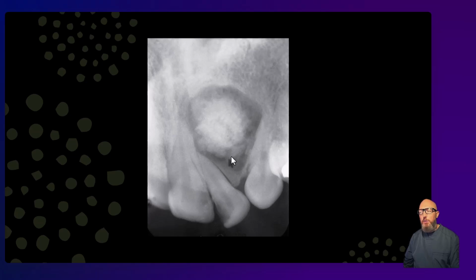Hopefully you're thinking of two things. The first one you might think, oh, is this female or male? You're maybe thinking AOT. What's the second one you should think of? Probably COC. And that's what this ended up being. Remember, COC is the bimodal tumor, or the bimodal cyst, I guess I should call it, where it can occur in teenage patients or older patients and occur in the maxilla or the mandible, slightly more common in the maxilla. So this one really fits for COC.